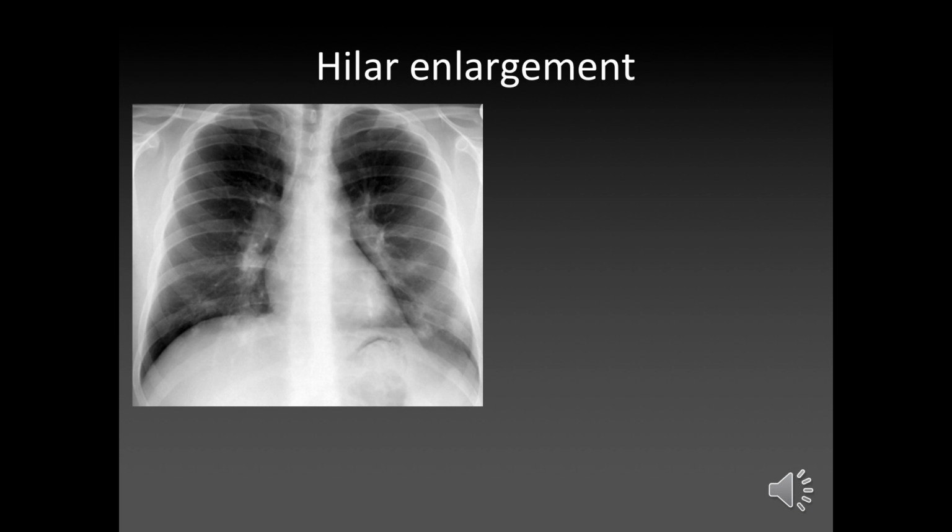And they're enlarged bilaterally. So, when we were talking about distribution, we talked about both sides, whether it's symmetrical. So this is symmetrical enlargement. Does anyone know what condition you might get symmetrical enlargement in? Sarcoid. And yes, pulmonary hypertension, did I hear that? So yeah, they're two of the key ones. And heart failure is also something that you get bilateral hilum enlargement in.